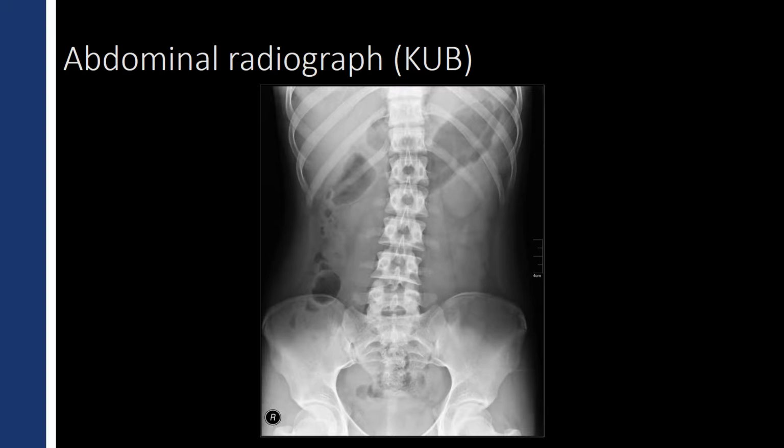Well, as far as soft tissue goes, up in the right upper quadrant, you'll see soft tissue that is the liver. And the liver will usually come down maybe a little bit below the ribs, not much in most cases, although sometimes women, for whatever reason, men don't have this, have something called a Riedel's lobe that will hang down as far as the iliac crest.